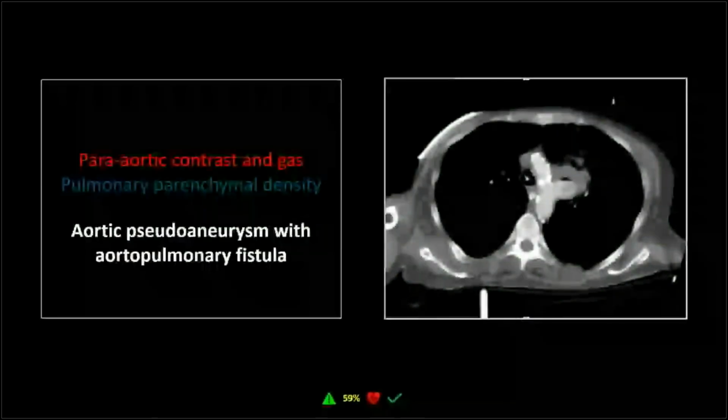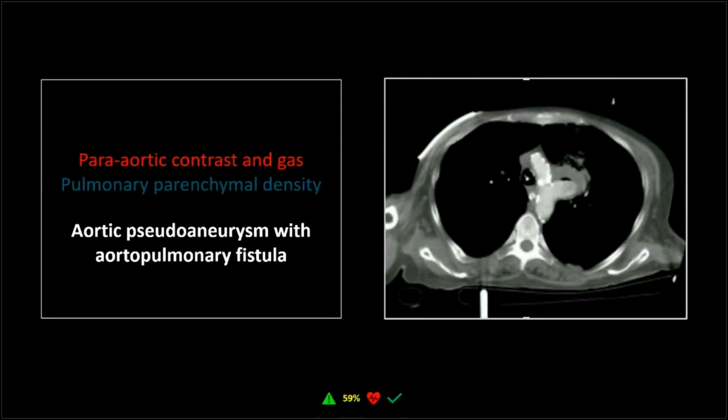All right, this one is just a very interesting, strange vector, I can only assume, where this patient's chest was compressed and it blew out the lateral aspect of his aorta. This is a strange place to see an aortic laceration. And again, it probably expanded the pulmonary parenchyma so abruptly that it kind of compressed it and kept that extravasated contrast all together in one place.